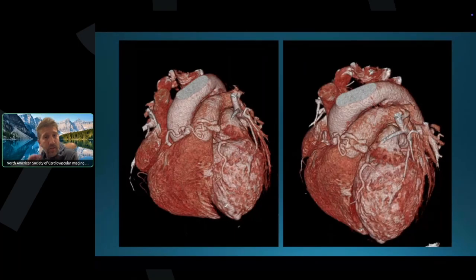Yeah. So this is a very straightforward case of coronary fistula, and it's a fairly common finding, and oftentimes just like this in this region. So this is a coronary fistula. Basically, and I'll go on in detail in a second, you have a coronary artery that's dumping into a chamber and not draining into its normal capillary network, right? So you have the coronary artery draining, in this case, into the pulmonary artery.